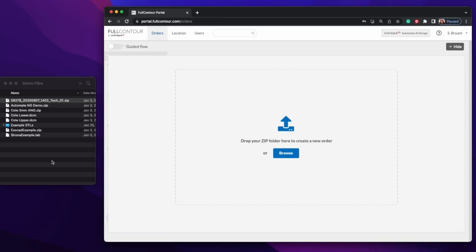In this video, I'm going to show you how to send four crown and bridge cases. We do design in 3 different design softwares. The first one up is 3Shape. We do need a complete 3Shape order zipped up into one file.